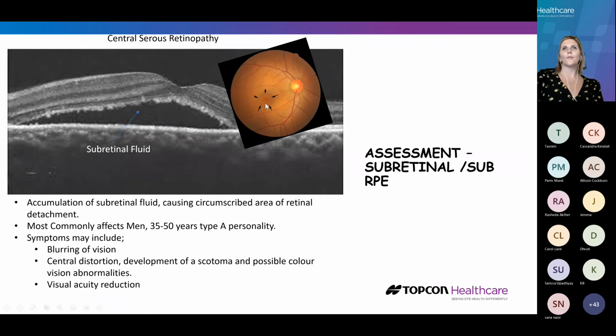You may have on some of your OCTs something called a shadowgram that overlays surface images of the scan on top of the fundus photo. Now, if you do, that can sometimes help you to visualize the structure, if you like, of the vessels, but also areas of fluid, drusen, areas of change, maybe floaters, and also doing a quality control check, looking for those small micro movements or those larger big blink artifacts.